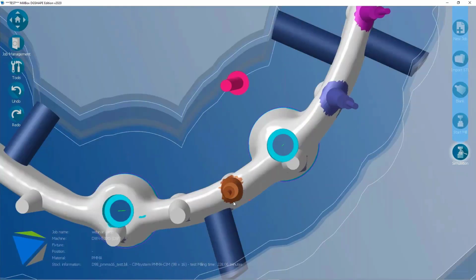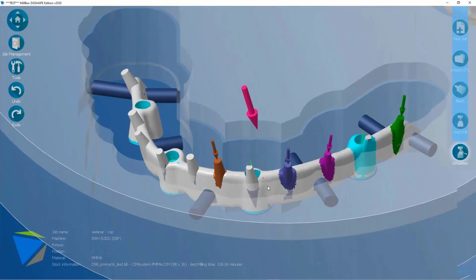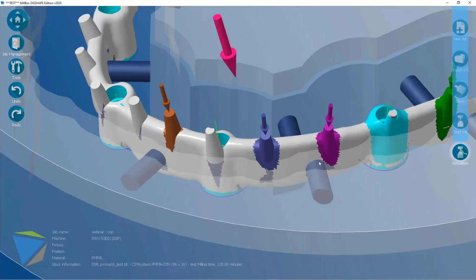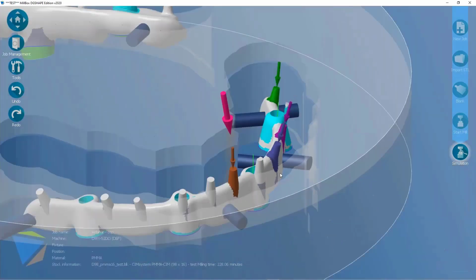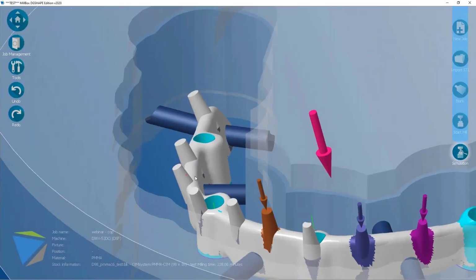We can see by color, because there's some arrow, particular additional operations on these selected areas. So that is thanks to painting. Then there's a brush command that lets me point and by my eyes decide the area and the direction of the additional milling. For example, to apply an additional finishing or a rest material or machining undercut. How to do that? Very easy. For example, take a look at this area.